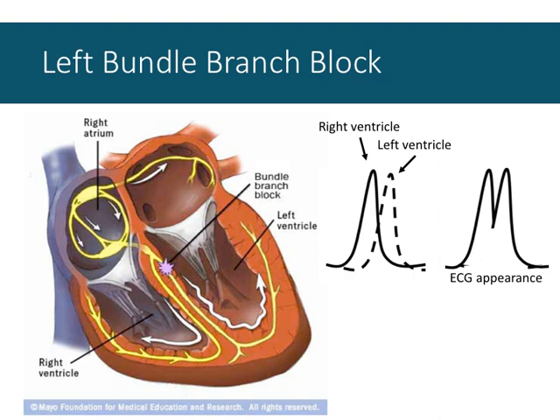And this is finally one example of where we can look to the chest electrodes for diagnosis. Most of the other information we've seen was actually in Lead 2. This is one of the first examples where we can look to the chest electrodes because those are the ones that look at the different regions, the different sides of the heart. Remember, V1 and V2 look at the right side, V3 and V4 through the septum, V5 and V6 through the left side or the left ventricle.